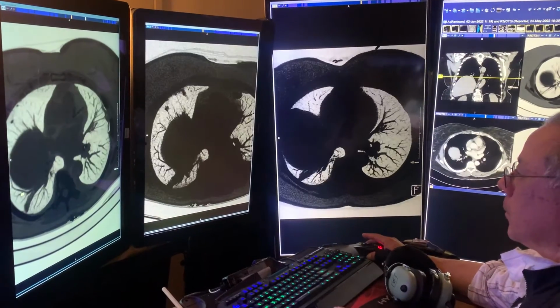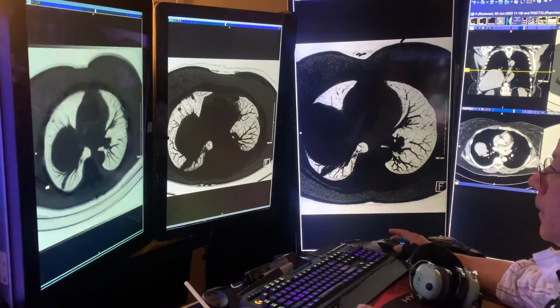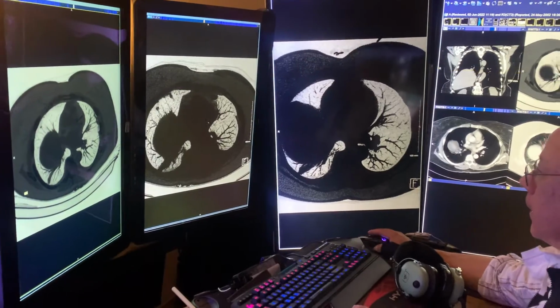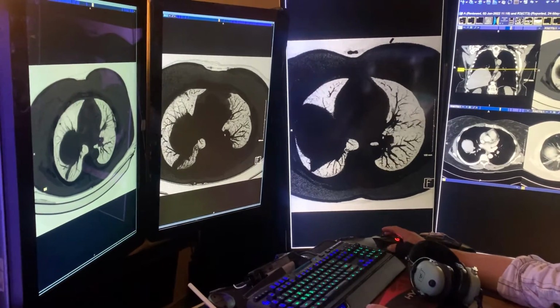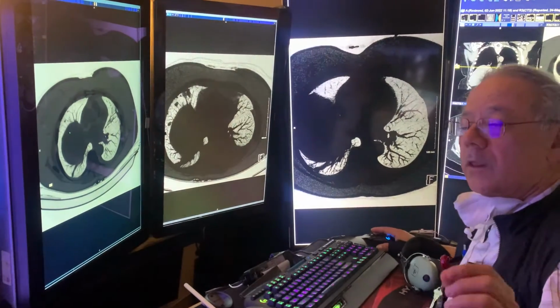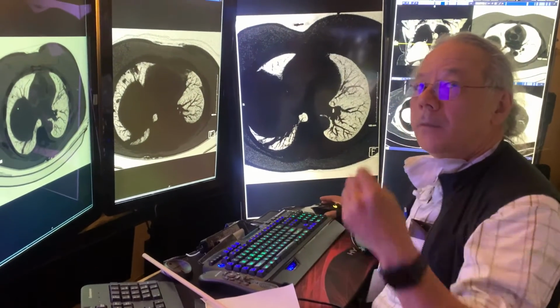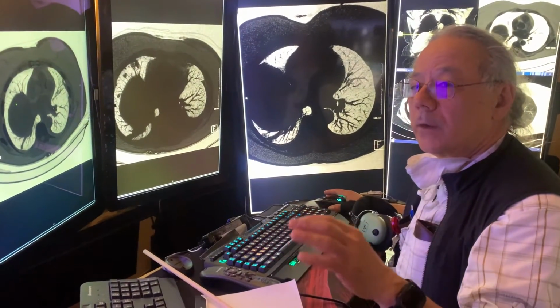So for example, the pleural thickening that I was showing you before is over here. And by the way, this patient who has breast cancer has some nodules here, but the nodules are getting a little small over here. Now I charge you to think about how long it would take you to put all that up and make that assessment. And that's the point of our flow.